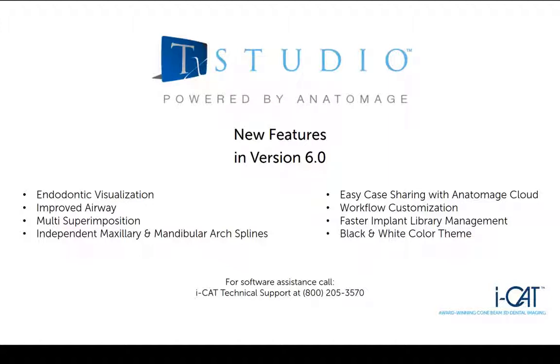With TxSTUDIO 6, doctors can create 3D volume renderings on their own computer, get cross-sections, trace nerves, place implants, print and save images, analyze airways, and many more functions. Let's take a look at a few of the new features in TxSTUDIO 6.